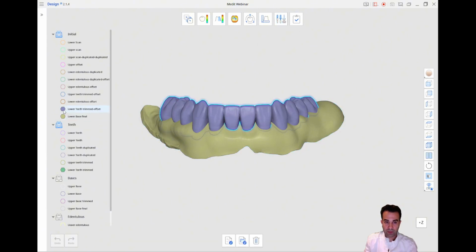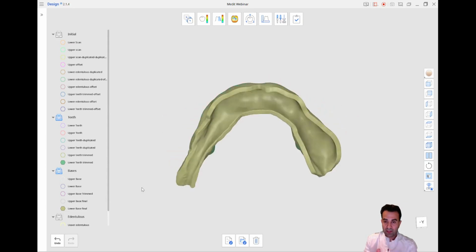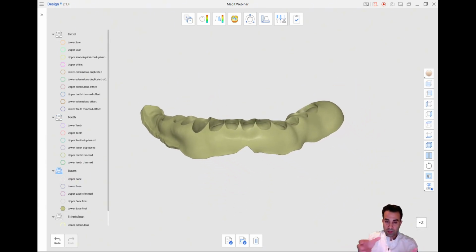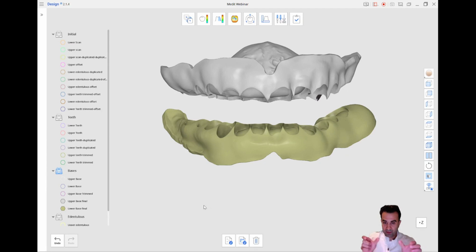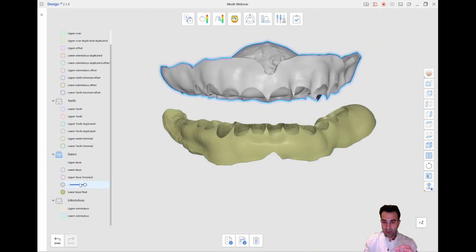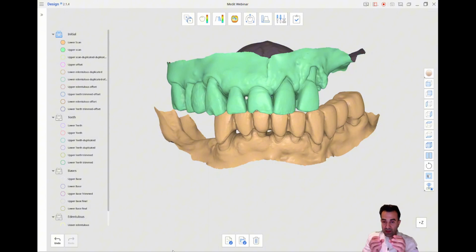And I'll show you how it will look. We can move it to the base. So now we have teeth seated within the denture base, and we have sockets. This would allow us to insert the teeth within the denture base without any friction, because we provide space for the bonding. And that space, we obtained it by doing two steps. Not a Boolean cut right away. We did offset, followed by Boolean cut. We did offset the teeth by 0.2 millimeters, followed by Boolean cut to create sockets that are slightly larger than the teeth.